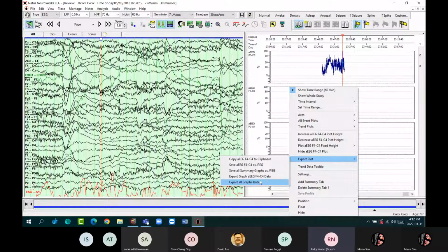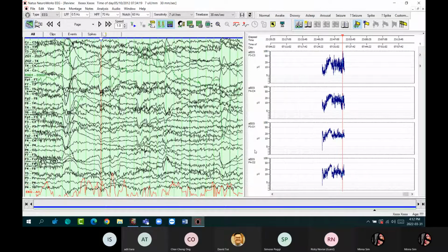Okay, thank you. That's not what I mean. I mean how to read this part, the result from the recording session. If the doctor asks a question, how do we explain to the doctor that this is the result from the trend profile?